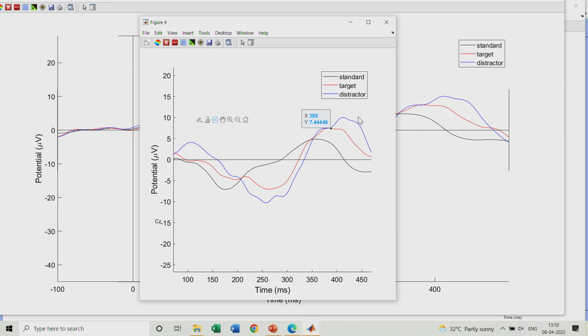So this comes because of several neurophysiological processes happening underlying your scalp. So that's why sometimes you get multiple peaks, sometimes you get a plateau as a result of multiple processes elicited due to your event triggers. So this particular thing you can see here is nothing but your response from your CZ electrode, and you can see a very nice P300 here.